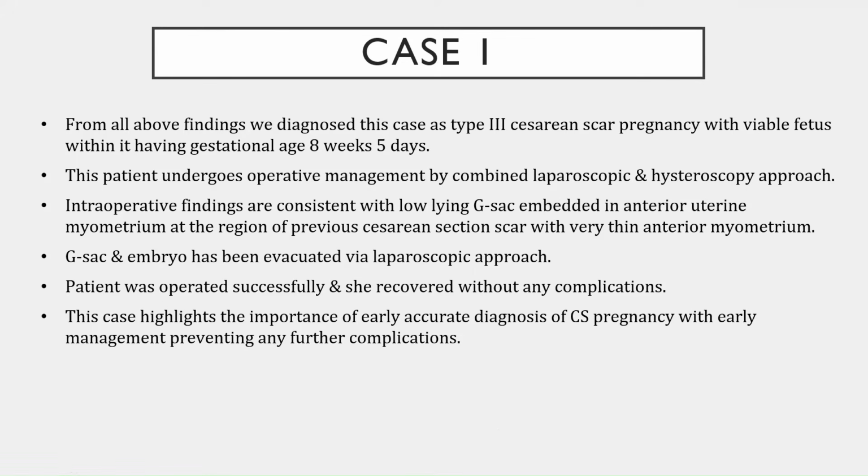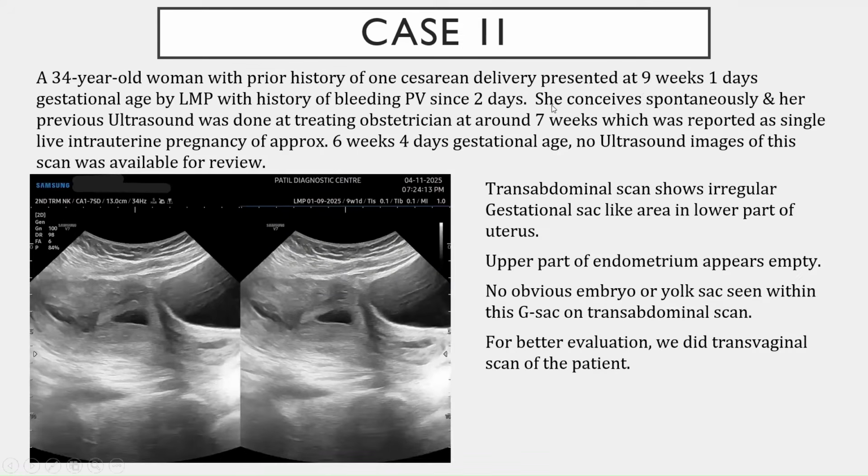This patient underwent operative management by combined laparoscopy and hysteroscopic approach, and she was operated successfully. This case highlights the importance of early accurate diagnosis of cesarean scar pregnancy with early management preventing any further complications. Let's go to case number 2.